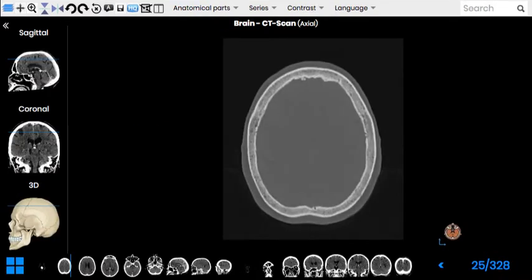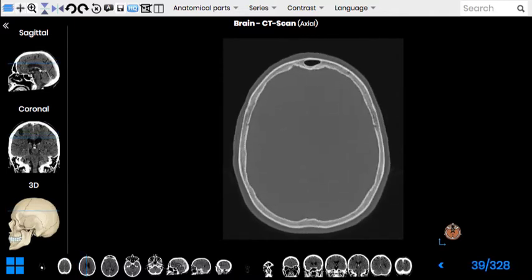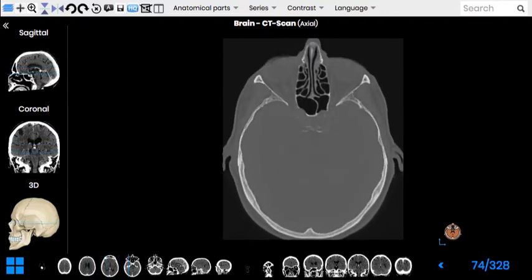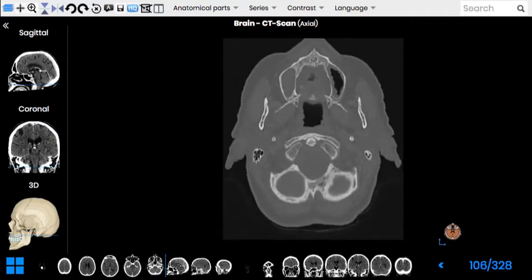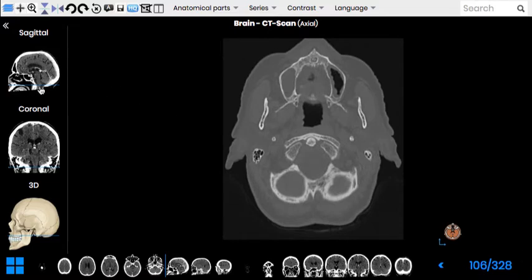Well, what I am going to do now, I'm going to scroll down and point your attention to the structures which we have in the neck. We are not looking at the head right now, so I'm just scrolling it down. But right here in the very lower part, in the outlet of the skull, you can see where I am according to this blue line on my left.